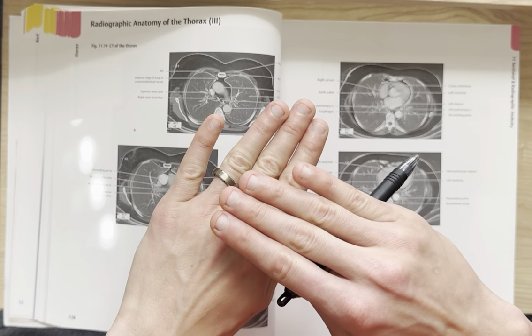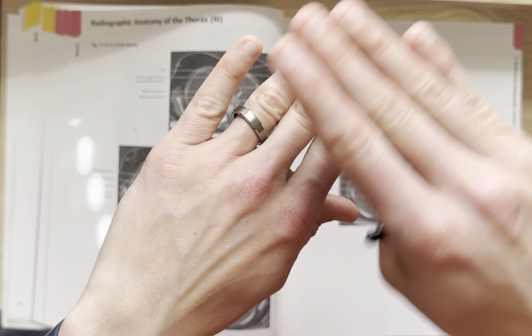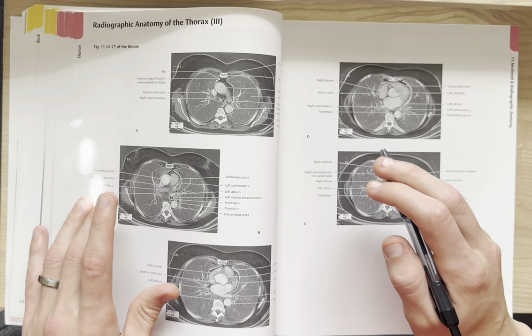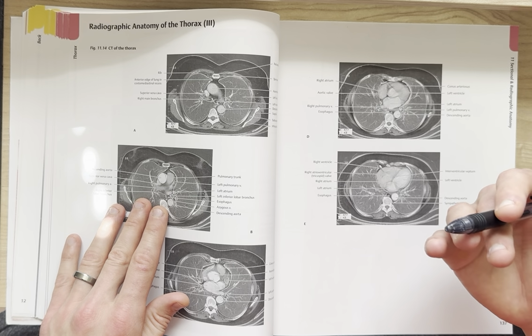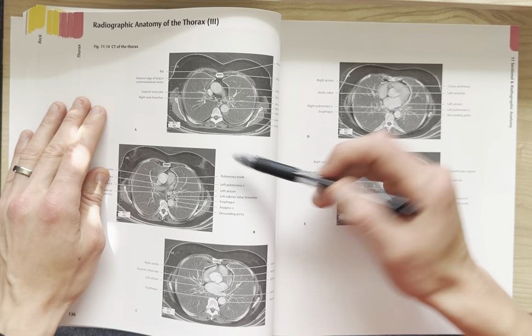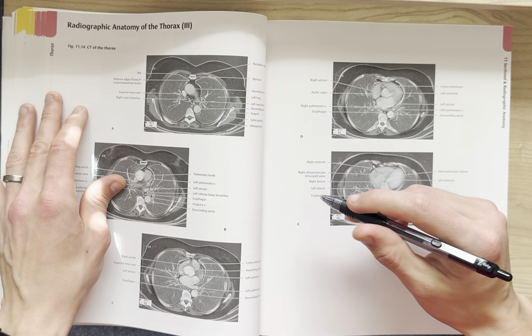It's like a very, very complex medical cake where you can kind of go through the patient slice by slice and see exactly what's happening at each level, and if there's anything that's amiss. Again, going back to the idea of internal bleeding or a tumor or a cyst or anything like that, you can go through level by level and identify, okay, what are we dealing with? What's atypical? What's baseline? And really get into it.